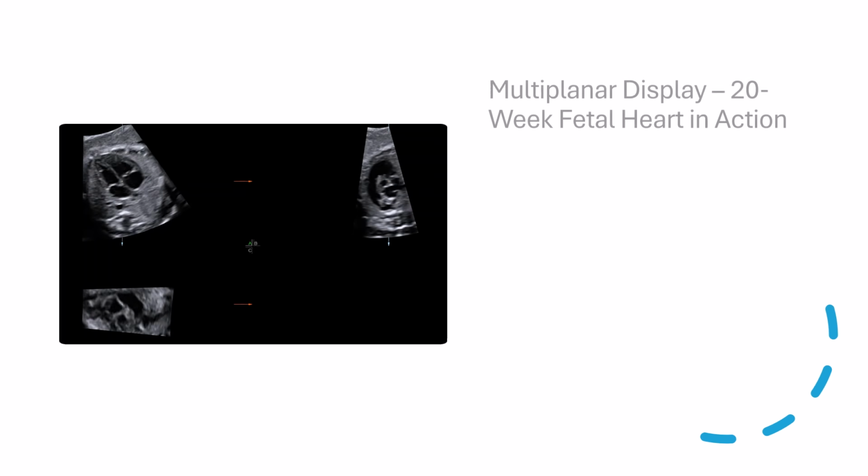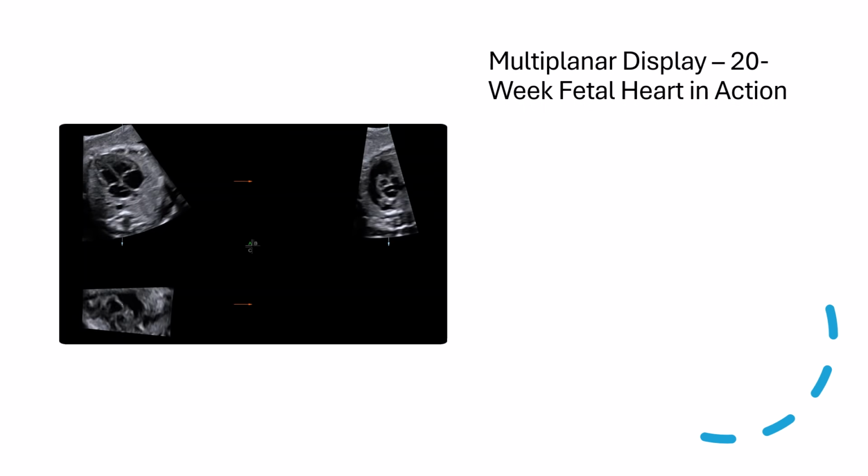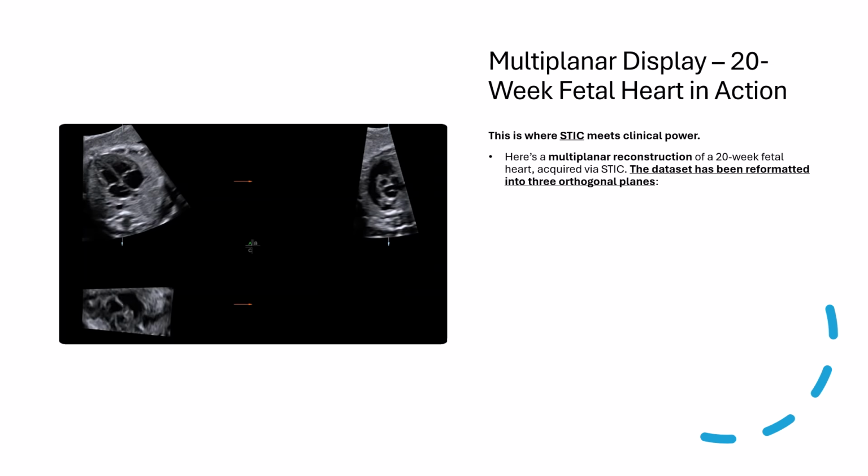Now we are getting into the heart of the clinical application of STIC technology. In this slide, we are showcasing a multiplanar reconstruction of a 20-week fetal heart acquired by STIC.